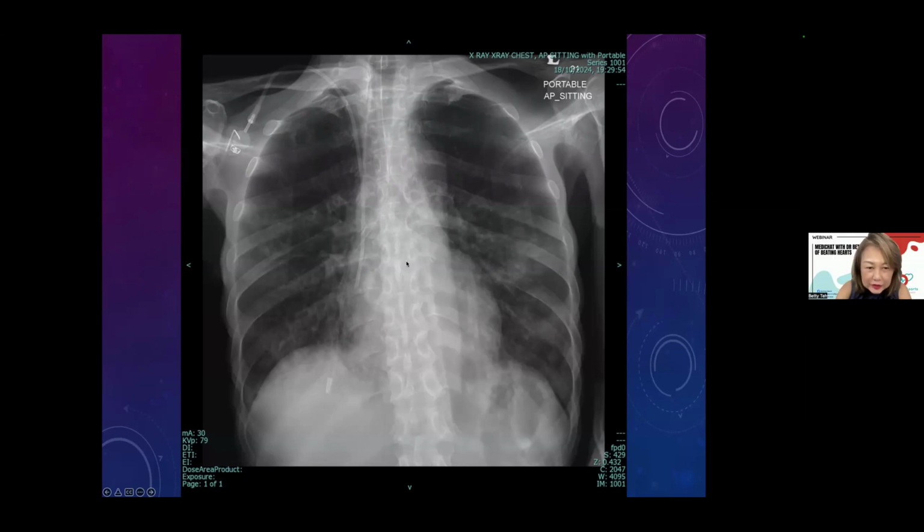So okay, the tip is this, the tip at the bottom there. This is a tip, quite lower down already, you see? Wow. If it starts feeding, I cannot imagine, man. Yeah, it will be a disaster, I think. So sometimes the NG tube is in, but it's just stopped at the distal esophagus. Sometimes it's here. Also, it's considered malposition. So you have to inform them to put it deeper and then into the gastric outline. If not, the patient will have aspiration pneumonia also. Okay?